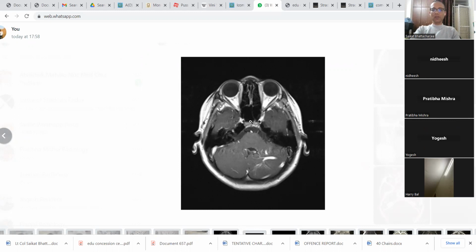DIVFs. Come again? Dural AVF? I mean, there's nothing to suggest a dural AVF or anything. There's just a thickened vein and there is some medusa head kind of appearance. This is a standard DVA, developmental venous anomaly.